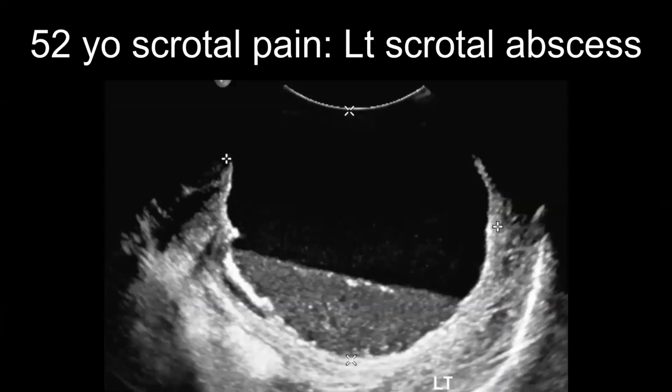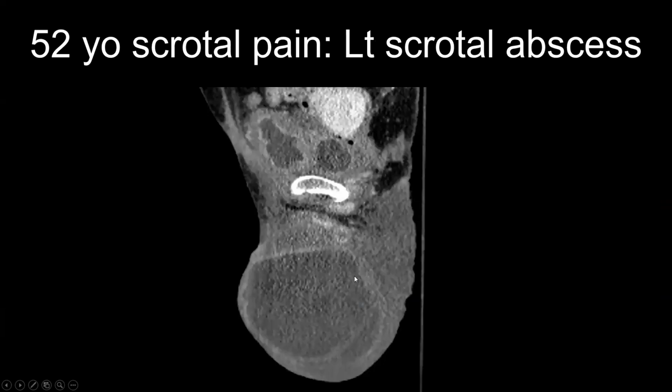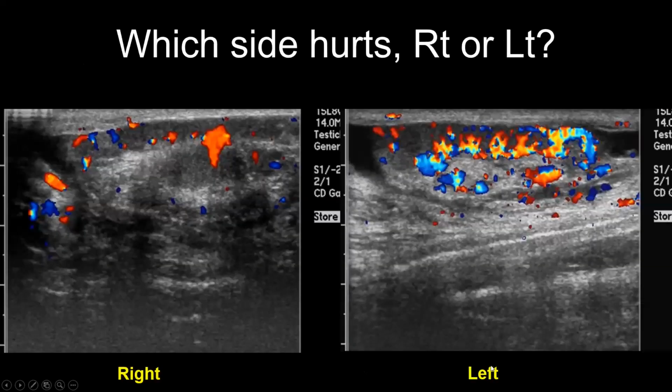And this is another patient, a 52-year-old, who had a huge scrotal abscess on this ultrasound image. And then the CT image, huge abscess. Okay, moving on to another category.